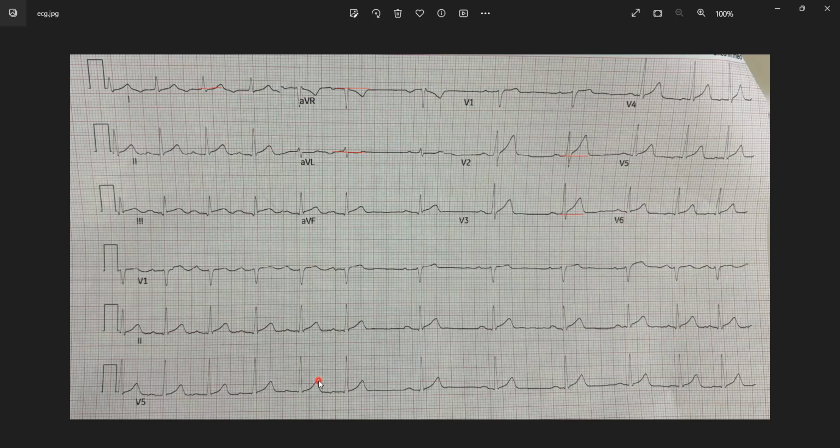But the reason for the Mobitz type 1 could be infection or infarction. So these are the things that we see in this ECG. In other words, now you are sitting in an emergency department. What do you do? It's quite simple.